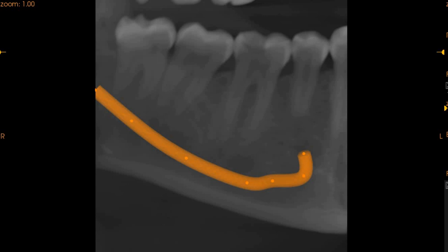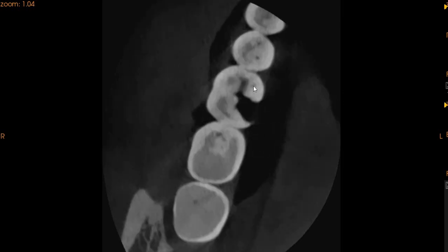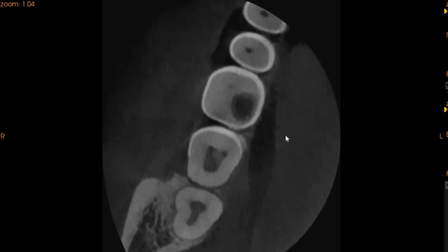We will show you on the axial view. Now, this is the axial view. We're looking at the tooth from the top. This is the pulp. This is the mesiolingual cusp, the mesiobuccal, the distobuccal, and the distolingual area. This is where the cavity is. As we are moving inferiorly, we can actually see that the cavity is here.